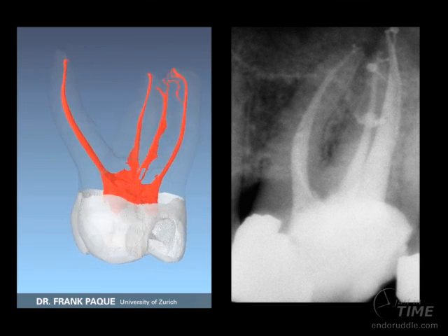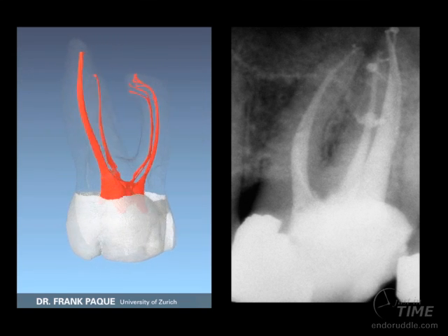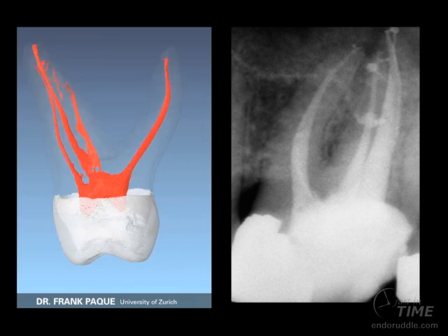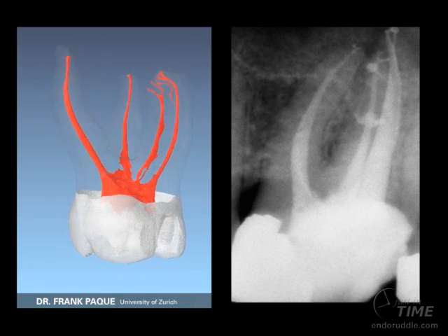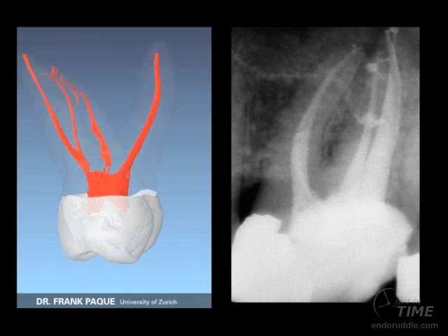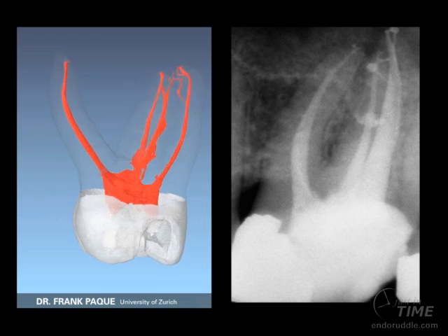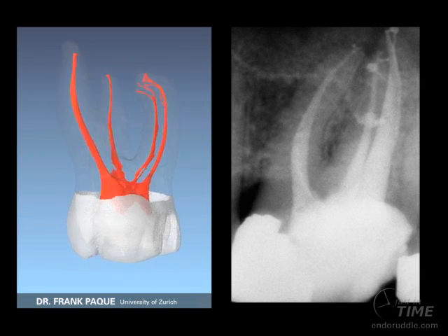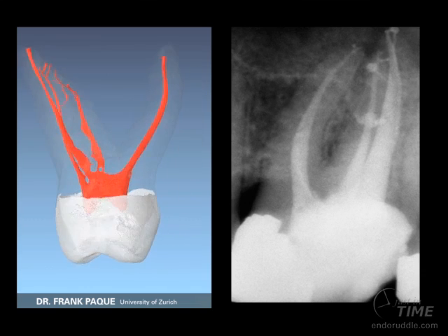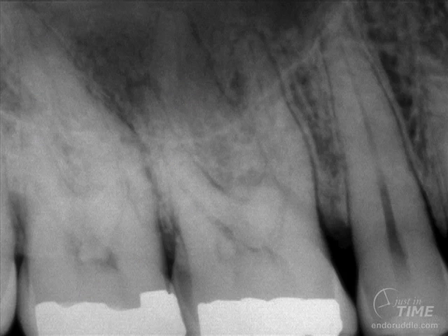Let's look at some of these canals, and you can see the tooth on the right doesn't have a classic MB2, but you can see a little opacity within the MB canal coronally, and that's a fin where material has been moved into that eccentricity off the rounder part of the shape. But notice in the DB and the palatal systems we have resorption, lateral canals, and apical bifidity.